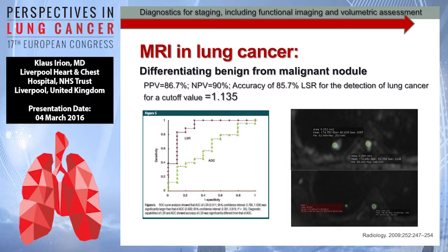One of the very important things to define malignancy or benignity of a lesion in the MRI scan is when you compare the diffusion of the lesion using a high B above 800 or 1,000, and then compare the signal of the lesion with the signal of the spine, as you have there, in the high B. This ratio has a very good area under the curve for sensitivity and specificity for malignancy.